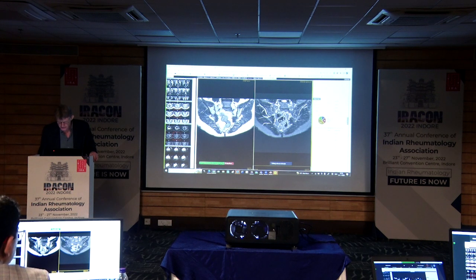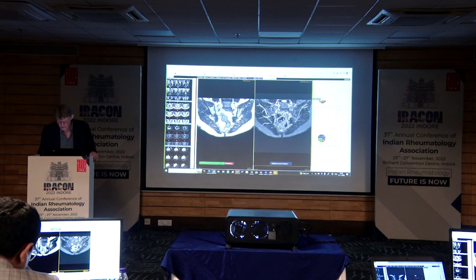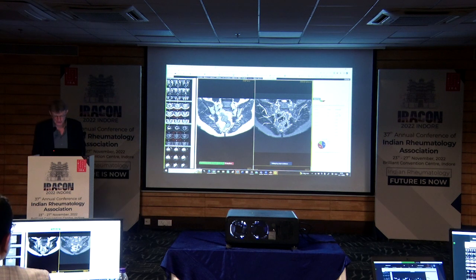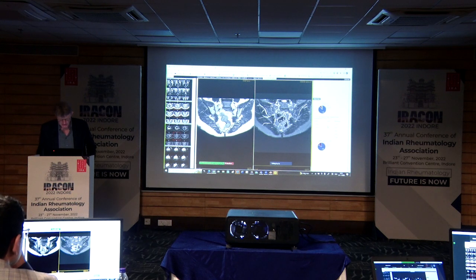And then where's the fat metaplasia? Well, it's everywhere, more or less. It's mainly in the sacrum, that's all you say, but it's also elsewhere. I'll show you. Bone erosions, also a bit everywhere. Fat metaplasia and erosion cavity, you actually, more or less half of you says that it's in both joints, and I'll come back to that, and I fully agree with that. It's not so easy, somewhere it's easier to see than others, probably more easy to see in the right joint. But we'll come back to that. Ankylosis, far majority says no, and far majority says certainly yes to axSpA. Good.